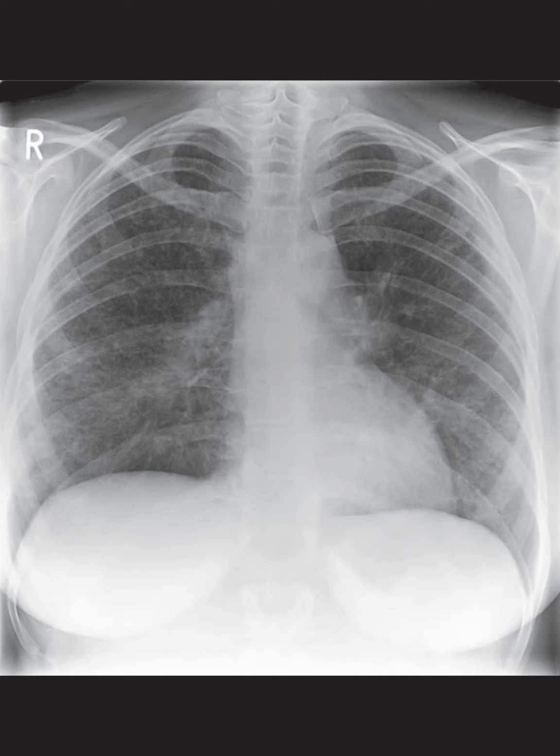Sarcoidosis doesn't just stick to the lungs, it can affect multiple systems. We could see signs in the liver, spleen, or even bones. The nodal enlargement and interstitial lung patterns we see here are typical for thoracic sarcoidosis. Sometimes these patterns can coalesce into larger nodules, and in some cases they might even cavitate, leading to fibrosis.